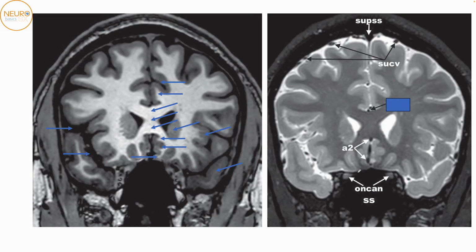Right, so in the next cut, everything becomes a little bit more obvious. You have the temporal lobe, which has become prominent now. You have the sylvian fissure separating the temporal lobe and the frontal lobe on both sides. Okay. So then again, you have the same structures.